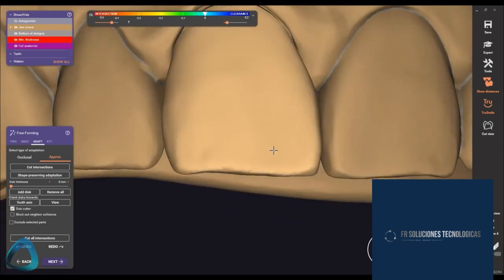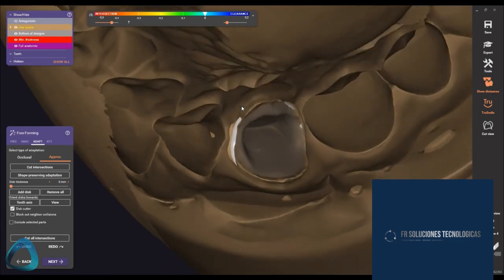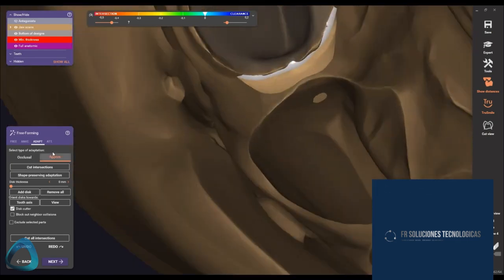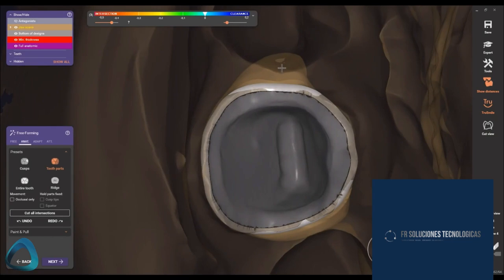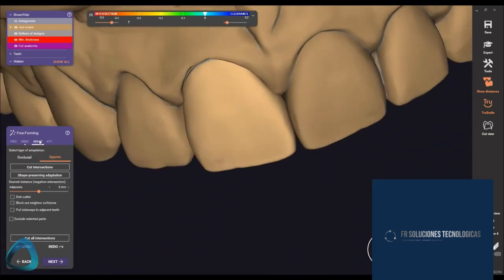Look from inside out and check if your disc cutter removed contact between the teeth. If so, go to Tooth Parts and put them in minimal contact again. Do the same on the other side. At last, go to Adapt again, put the value as 0.02 mm and cut again.